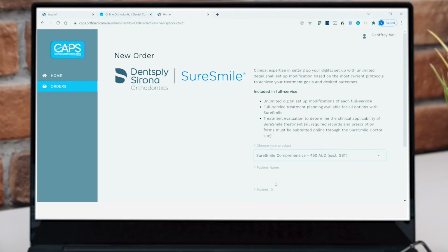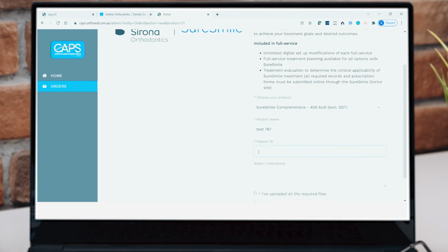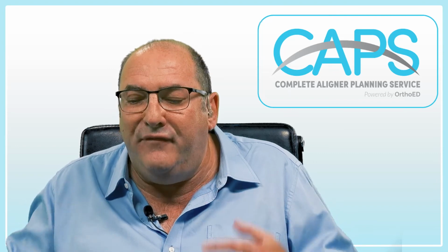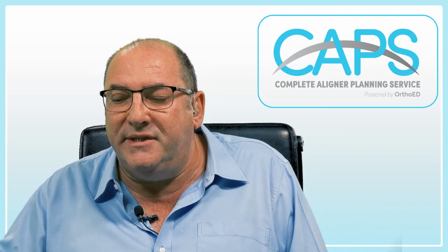So you'll have their name, and we'll do another test, 785, 787, and they will have a patient ID associated with it. You type in whatever notes you want, and these are just extra notes that may help us in giving you a good, optimized, efficient setup.